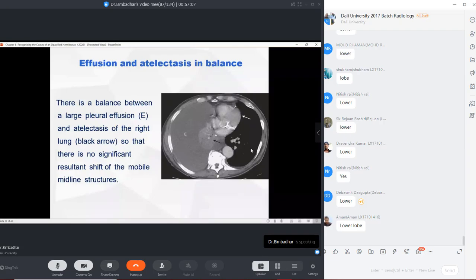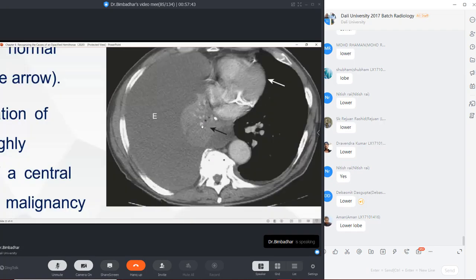And you can see here, if you look closely, this density is a little bit lower than this density. This is higher density, which means this is the collapsed lung. And you can see small black dots here. These small black dots indicate that these bronchi have completely come together. And you see these white dots are the pulmonary vessels, right? This lung is completely shrunken. So there is obstructive atelectasis of the one, right?